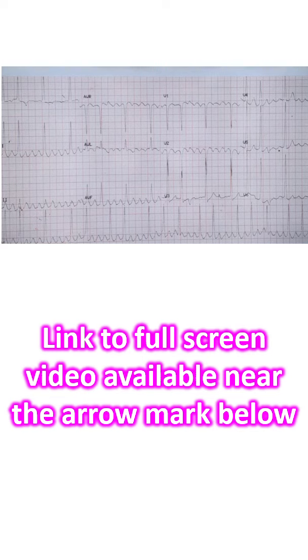Otherwise you have to say the ratio by calculating the RR interval and the FF interval, and comparing these two, you should say the ratio. Similarly, this is 2:1 conduction, because there is one flutter wave here and another will be there, and this rate is around 150 per minute, and flutter rate is usually around 300 per minute. So this is 2:1 conduction, this is 4:1 conduction, this is again 2:1 conduction.